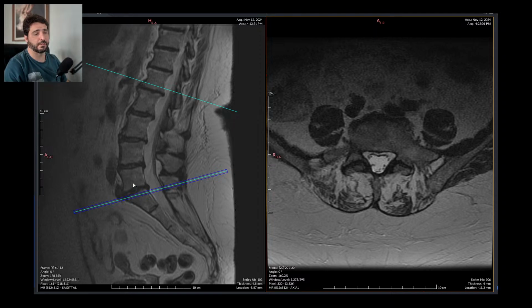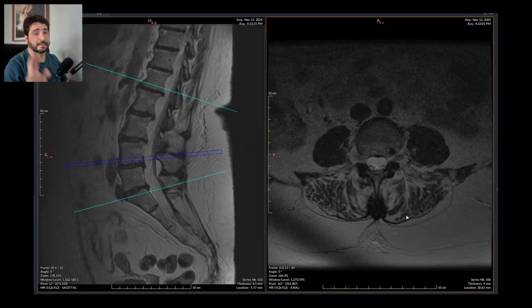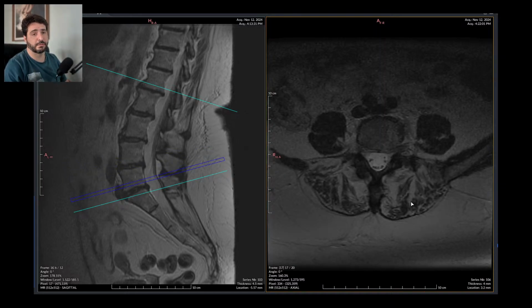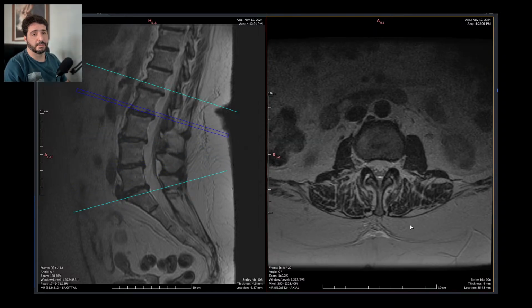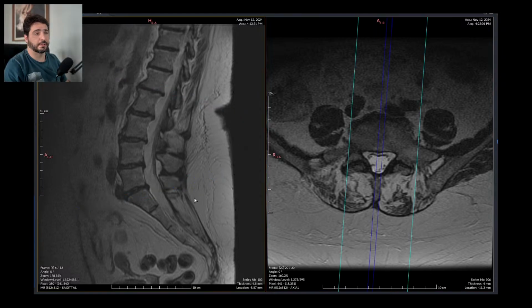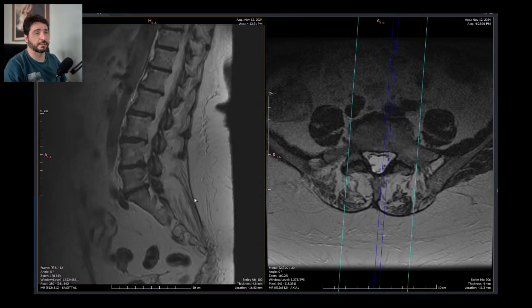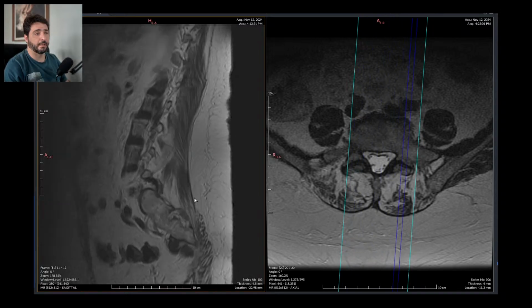He should have done a couple more cuts, got more slices downwards, and at least another slice upwards. They are saving time by doing an extremely bad scan. So they say it's for the best, but I doubt it's for the best interest of the patient, and it surely isn't helping me much.